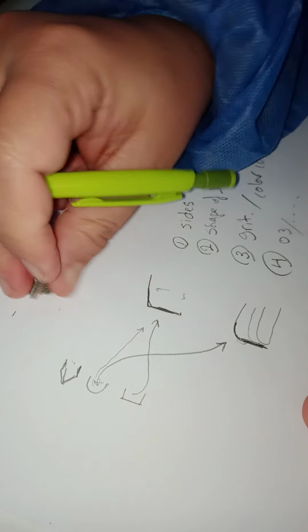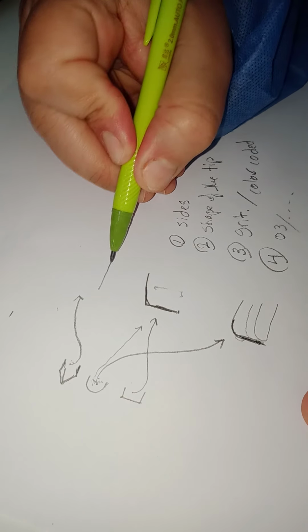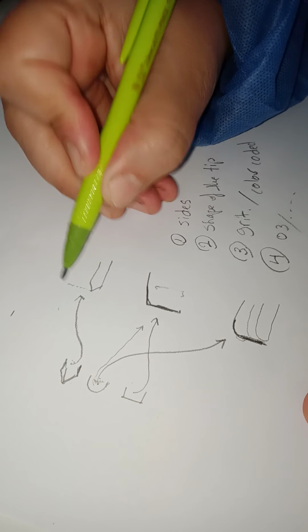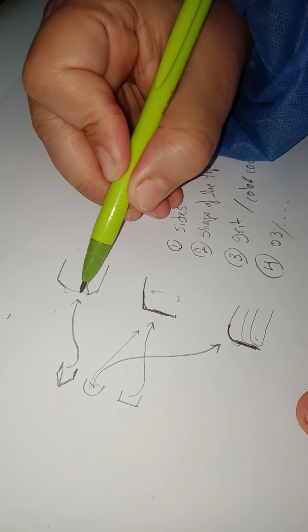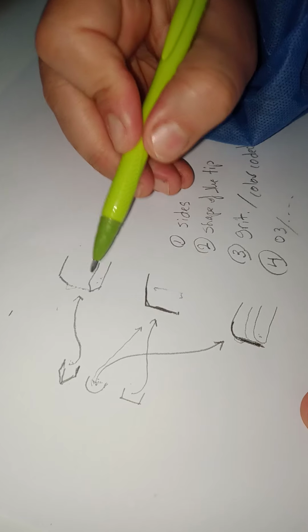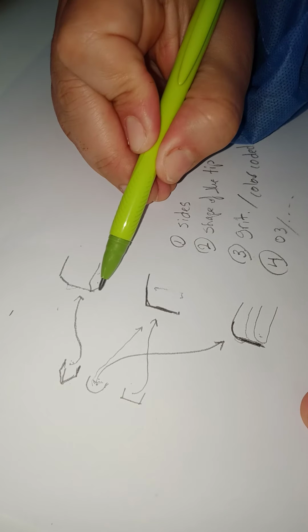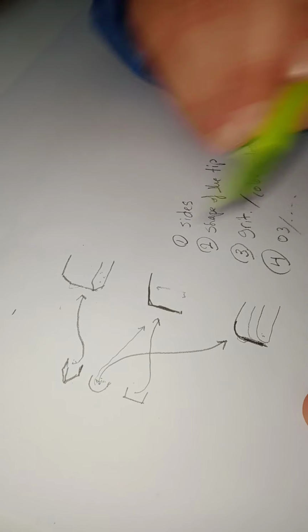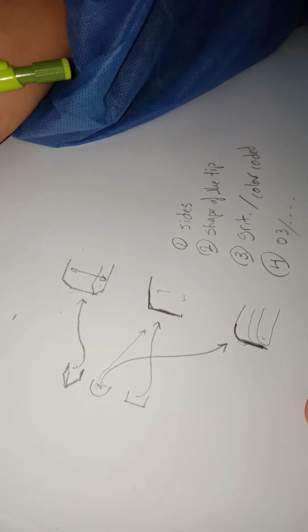What if I use this bur to create a shoulder? If I'm using this chamfer bur, this is the tooth at the beginning. I come in with the chamfer, and it will create this shape. Then I go deeper, and the shoulder at the end will have this shape. But once more, the same risk is present: if I go deeper here, I will have a ledge on the tooth. So using the bur, you should be careful to go in consistently on the same line without any interruption of the area, and you reach the exact depth. Okay, so this is the second issue, which bur is used to produce a shoulder.